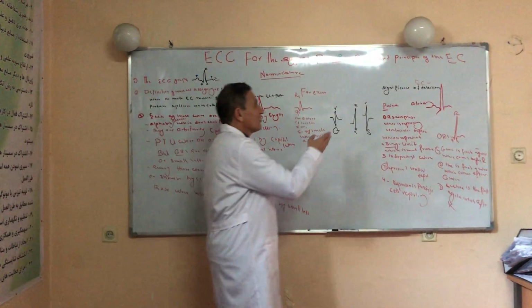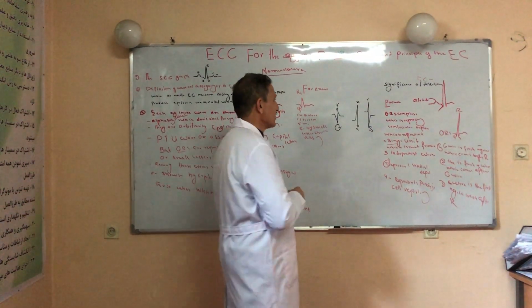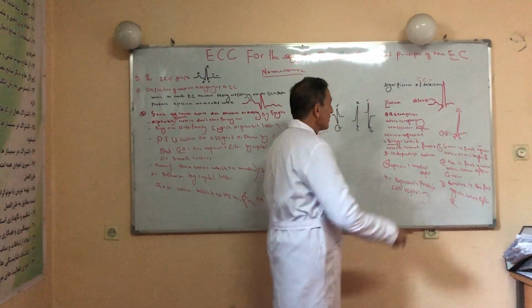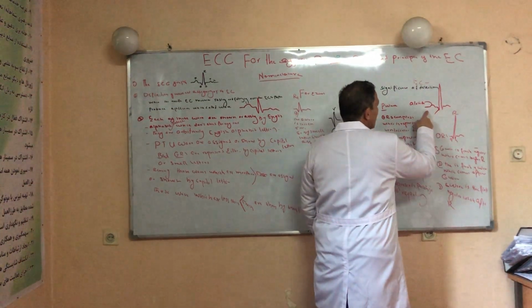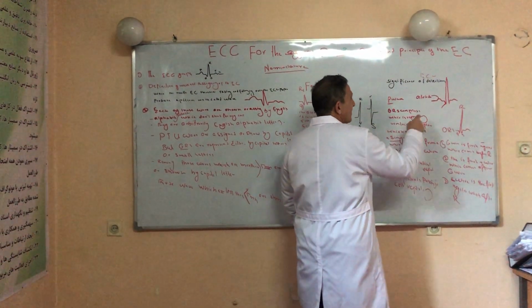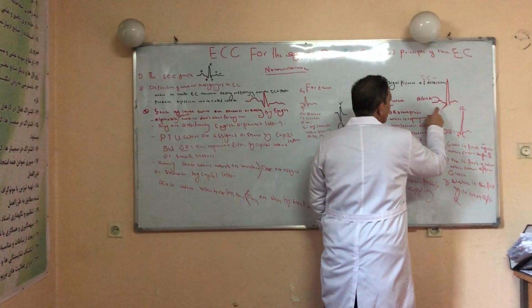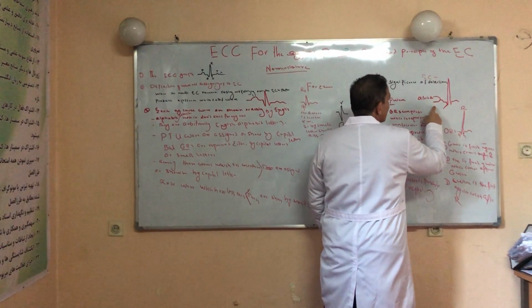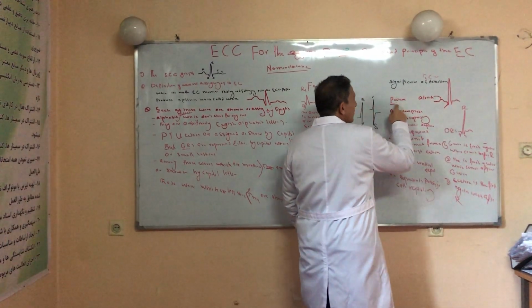Then we'll be discussing the significance of ECG deflection. The first wave of the ECG is called the P wave. This P wave represents atrial depolarization. It is the first wave, a round, positive wave, produced with moderate conduction.